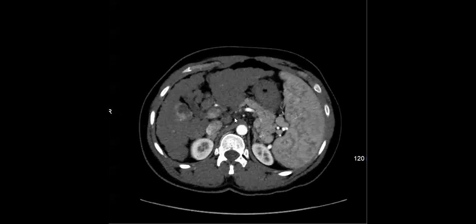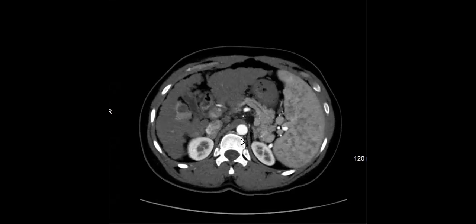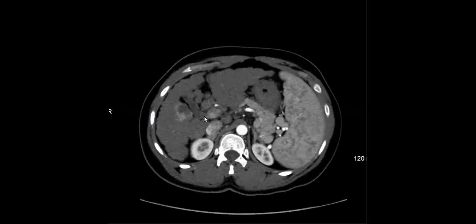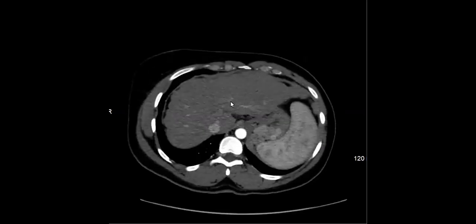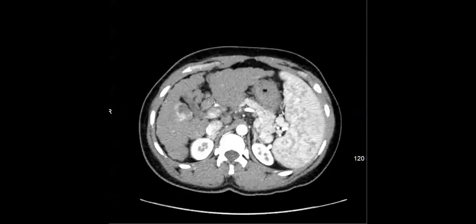So this is not an eye test. You can see the patient has cirrhosis. She's relatively young. I forget how old. Actually, very young. The cirrhosis is congenital, either C or B, I forget. She's very young, in her 20s. You can see pretty advanced cirrhosis, and she comes in with this lesion.